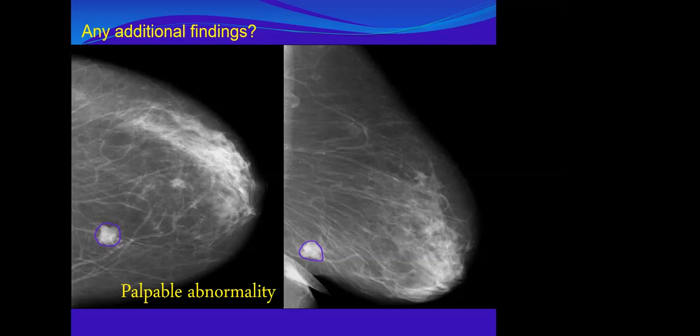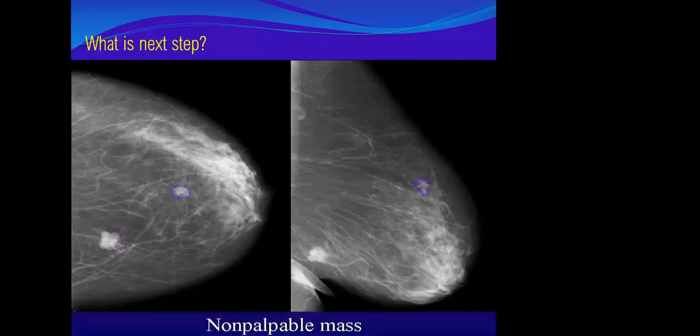Yes, it could be multifocal. And if it is another lesion, it will be multifocal or multicentric. Okay, so these are the lesions. This is the palpable abnormality, while this is the next. This is the other lesions.